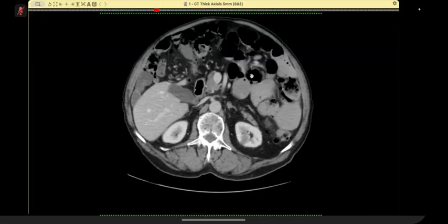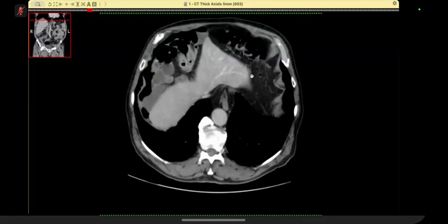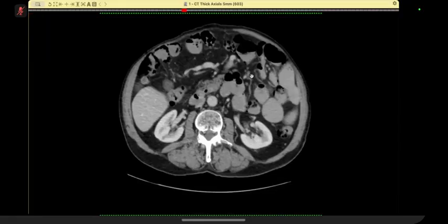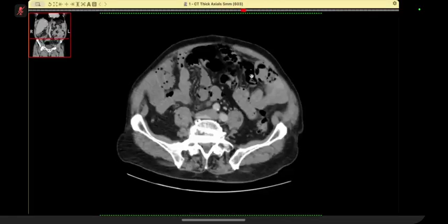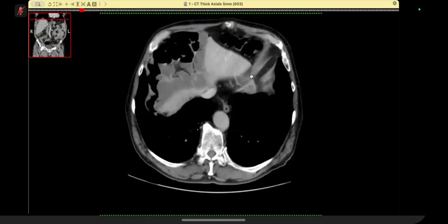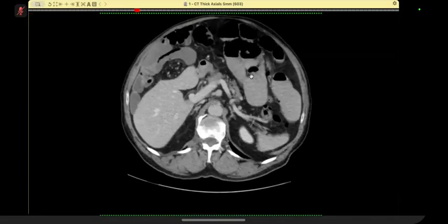So what are you going to advise? Sir, there is pneumoperitoneum, but as we couldn't identify any surgery-related cause, I would just convey the findings to the referring physician and keep the patient under follow-up. I would advise decompression, like inserting a nasogastric tube or keeping the patient nil per oral, to avoid septic conditions in this patient. Because we couldn't identify any intestinal obstruction.